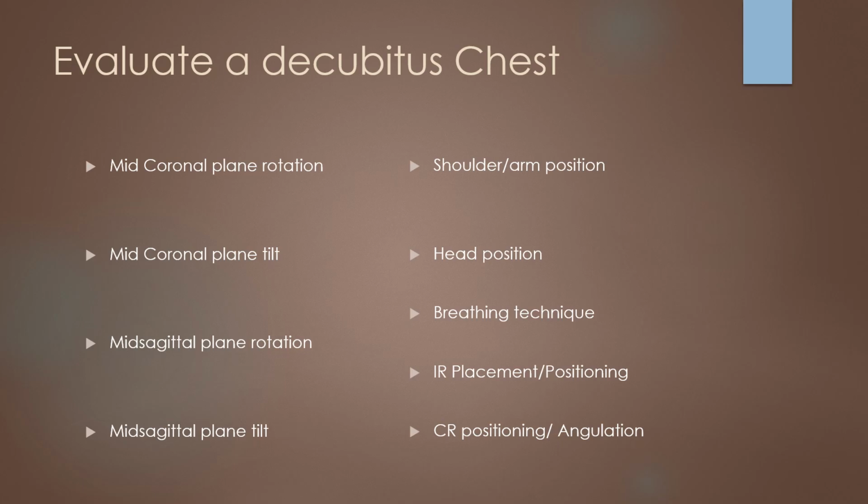Okay, so we kind of already talked about how we're going to evaluate the decubitus chest. You can take a minute to look this over, fill in your blanks, and then we're going to come back and see how correct you were.